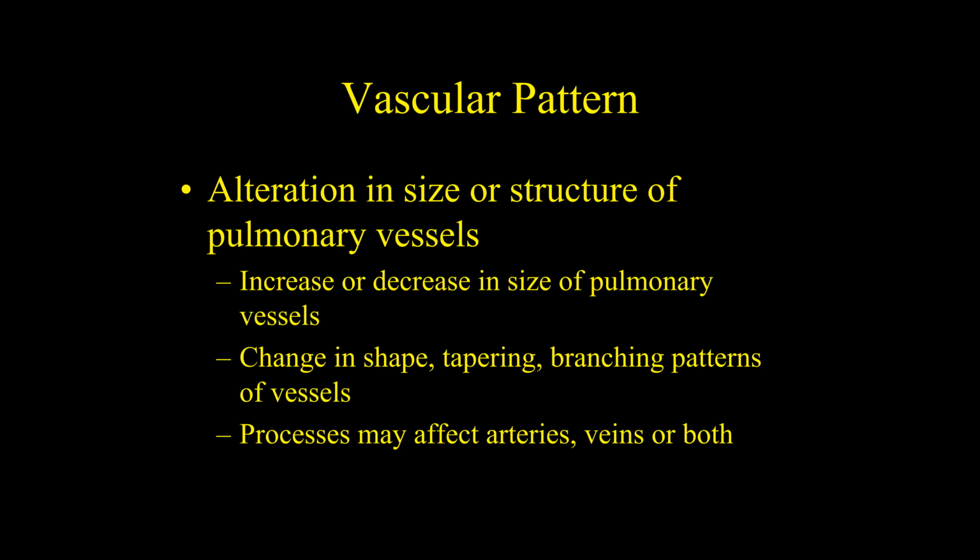If it's caudal dorsally located, it's either going to be cardiogenic edema or non-cardiogenic edema, which is also called neurogenic edema. And the differentiator there is whether the left atrium is big. If the left atrium is big, that means usually they have underlying heart disease, and then it's going to be cardiogenic edema. And it will be caudal dorsally located unless you're a cat or a Doberman, and then it can be anywhere. Okay, so that's the review of those two patterns.